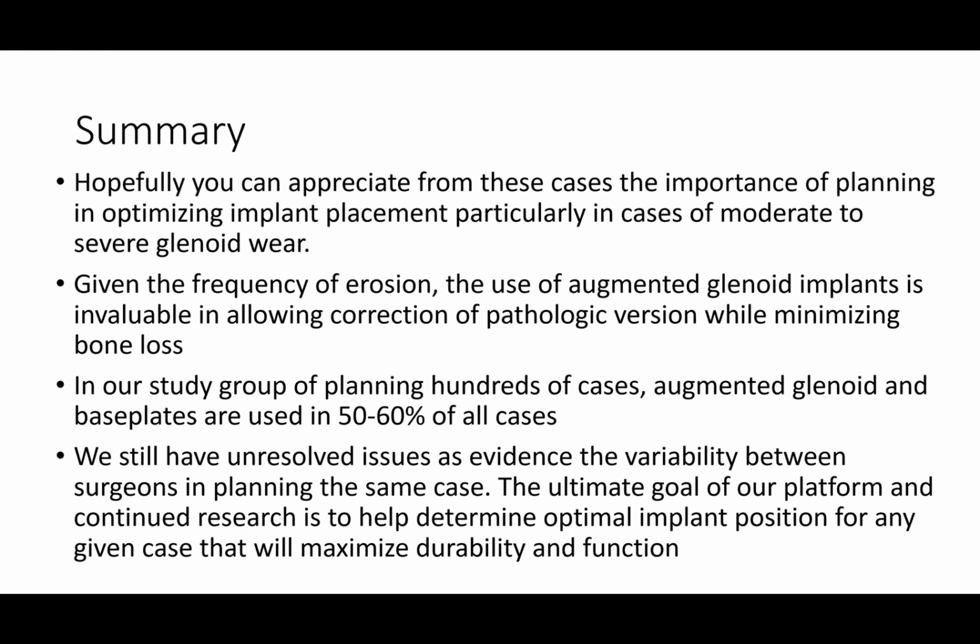And as you can see from earlier on, we still have some unresolved issues, as evidenced by the variability between how surgeons will plan the same case. And the ultimate goal of our platform and continued research is to help eventually determine the optimal implant position for any given case that will maximize its durability and function.